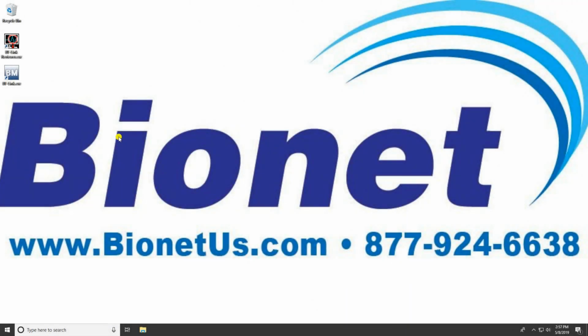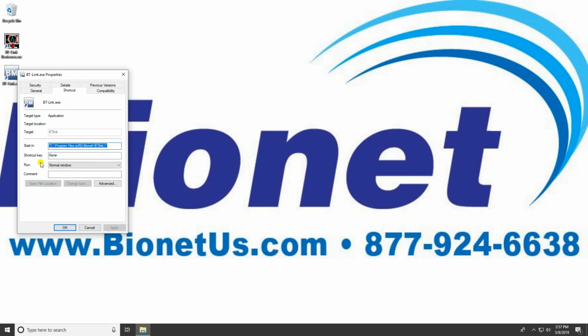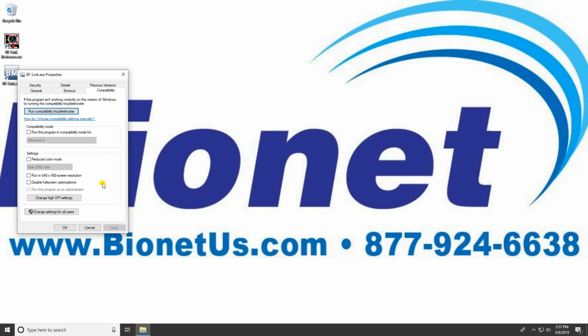Once the program has been installed, right-click on the shortcut icon on your desktop and select Properties. Choose Compatibility and click the box to Run as Administrator. Apply the settings, and your program is ready to connect to your patient monitor.